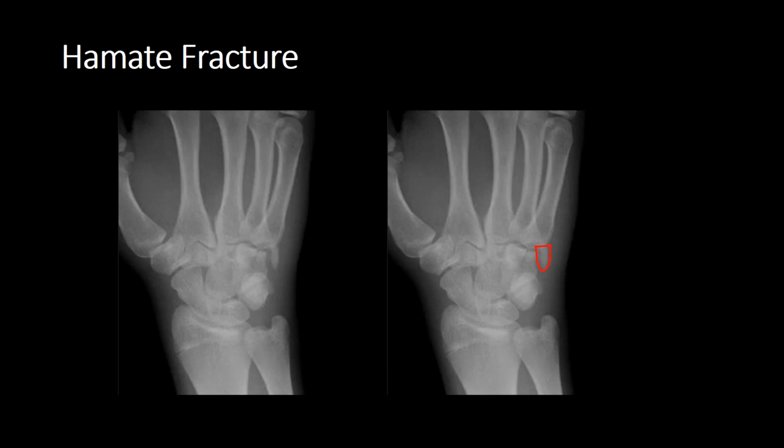The most common type of hamate fracture usually occurs as some kind of scrapper's fracture, where rather than fracturing the base of the fifth metacarpal, it results in a fracture through the medial cortex of the hamate. Sometimes you could have a fracture dislocation, so you may get a dislocation of, say, the fourth and the fifth metacarpals and associated fracture of the hamate. It's important to check all round the hamate to make sure that you don't miss any small fracture sites.